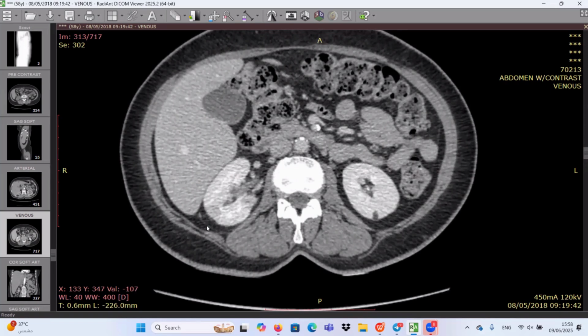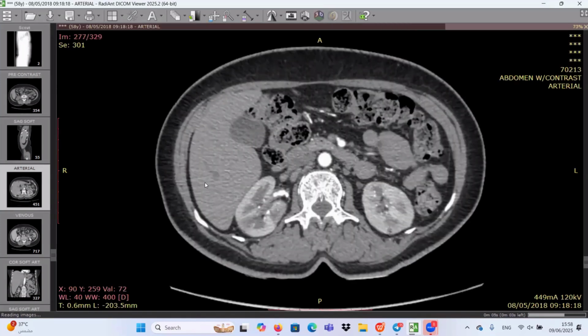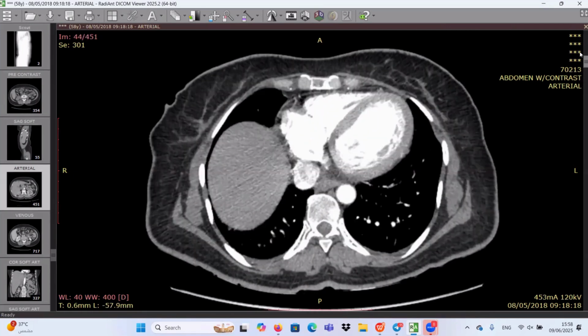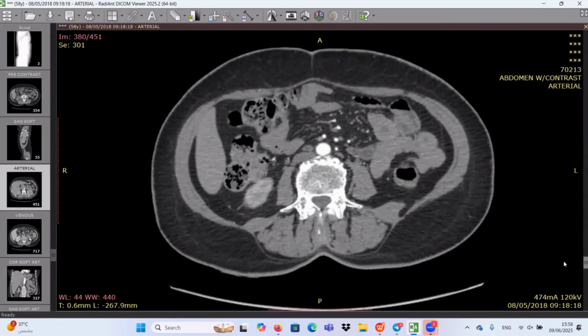Okay, if I diagnose this case renal infarct, what is the next step? Could be a nuclear study. You should search for the cause. Yeah, we should search for the cause. I think I uploaded the standard FRCR approach video, that once we have any abnormal findings, you should search for any cause.